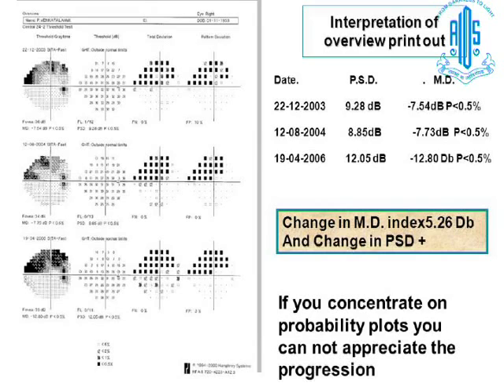And when I learned this, I was told, put a teacup on the grayscale. So I was under that impression. I never concentrated on it, and I used to see only the probability plots. Even the concept of the probability plot didn't sink into my mind. A black square, in those days we used to think, means absolute scotoma.